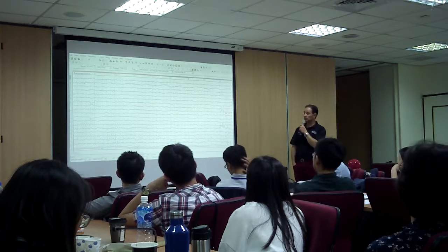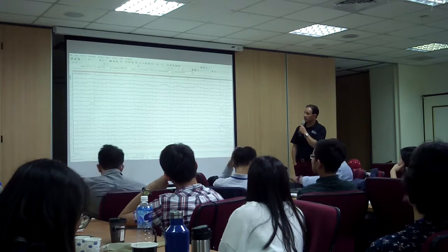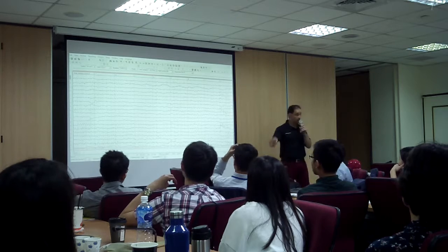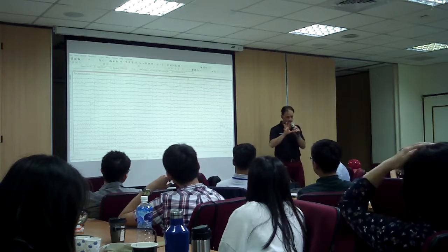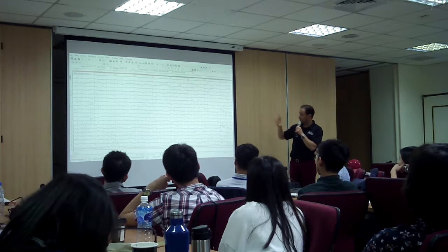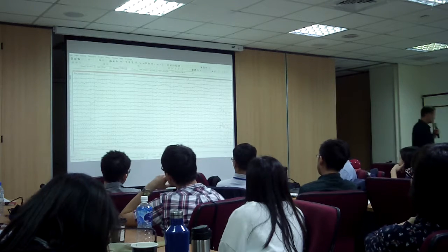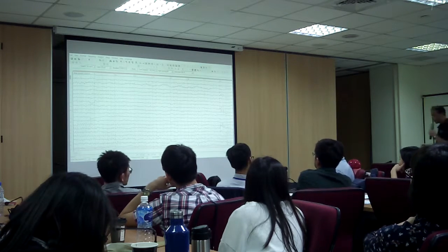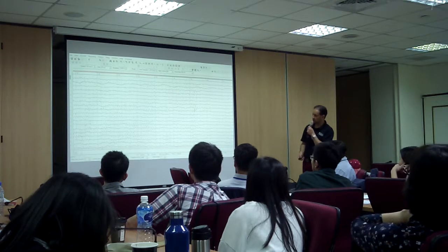So he went to Bogota for a brain map. So we're going to look at it, but it's going to be you guys who are going to tell me what you see. All right? So we already have some basic information. I want you to look at the EEG, and I want you to tell me if you see anything that's interesting to you. So what I'm going to do is I'm going to start right here, okay?